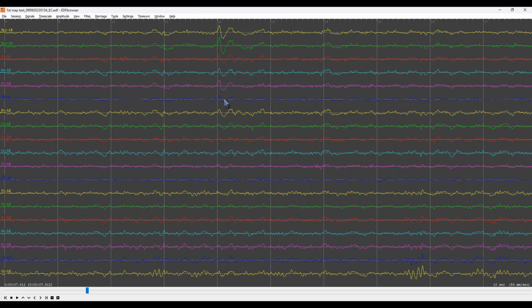So, you look at enough of these and you can kind of say, yeah, this is a normal signal versus, yeah, that's abnormal. Like when we see here, these peaks and then the valley, and then it kind of stabilizes, we know this is all artifact, and it's just cascading through the whole frontal section of the brain. As we move more posterior through central, temporal, parietals, it dissipates and we really don't see it. So we know this is probably an eye blink.